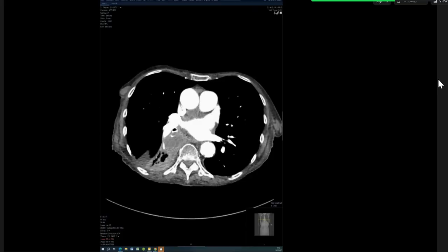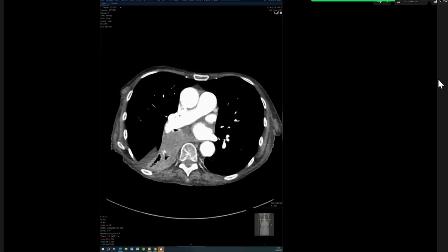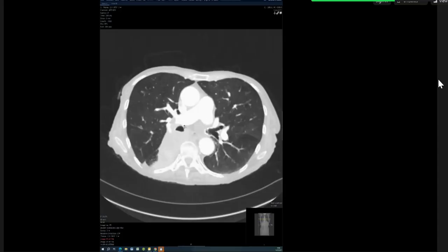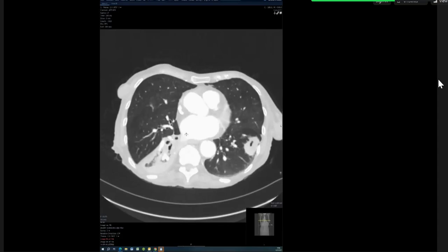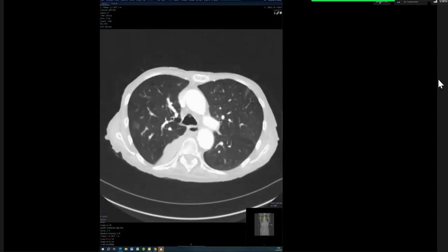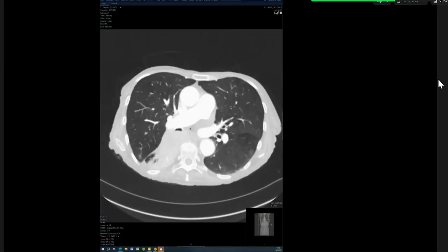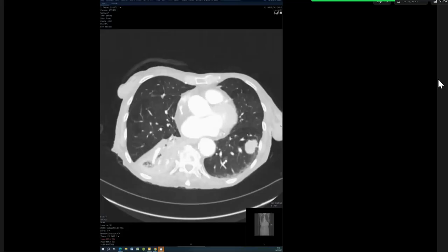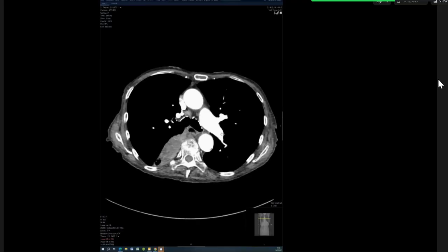So this tumor, when possible, we want to access tumors endobronchially, and this one is a prime example. This can actually be debulked. So when you say this, if this was actually benign, this patient still needs a bronchoscopy, because there's something occluding that bronchus causing collapse. So they need bronchoscopy regardless. But in this case, you would say, I see compression of the airways with occlusion causing distal collapse. The patient needs endobronchial sampling and wash to establish an underlying diagnosis. But that's the primary, and this one is the MET.